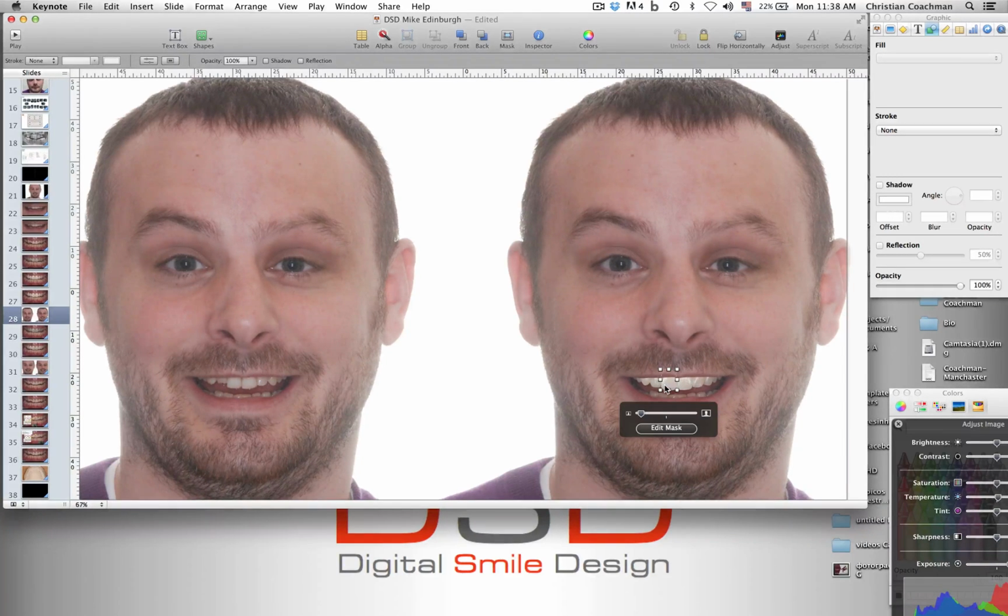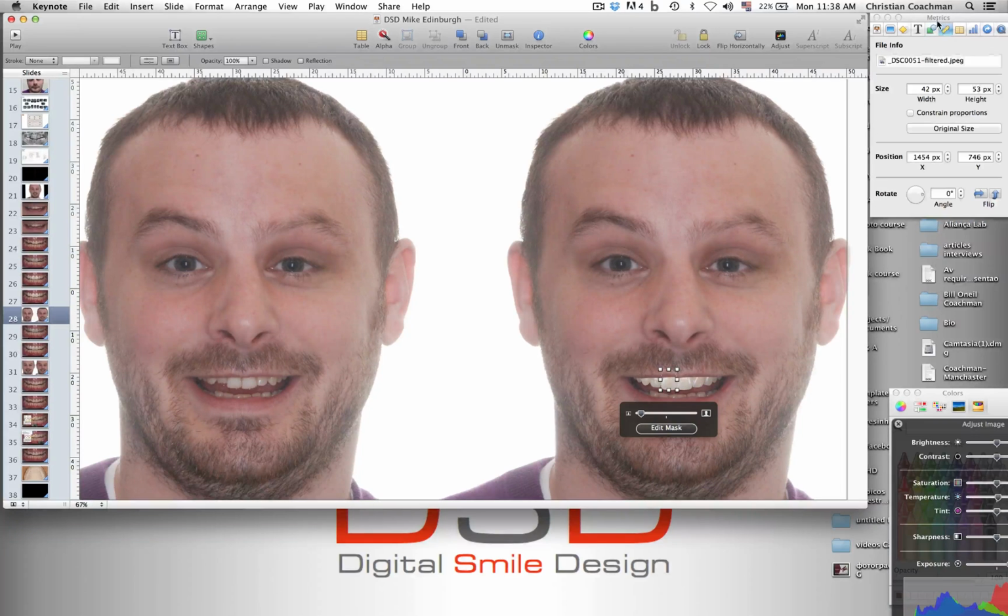And then here, of course, you can change the position of each one of the drawings. You can make them wider. If you go here to the ruler metrics, you can change the width and the height. So I can increase the height of the teeth or the width.